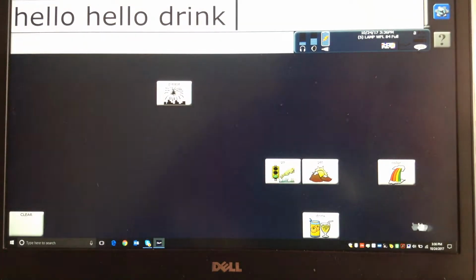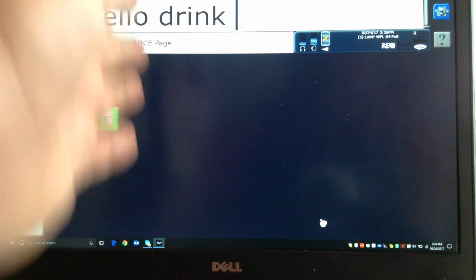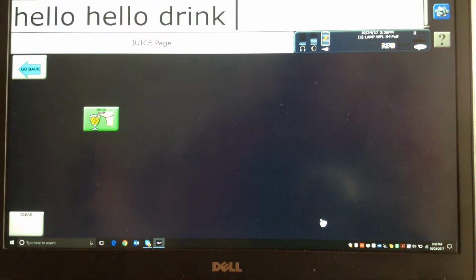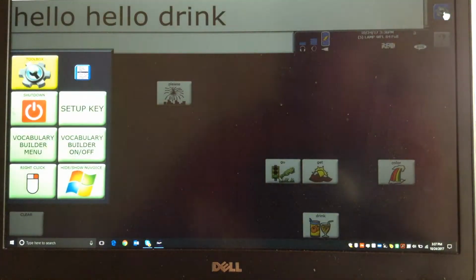So see how they're floating now. So when I hit this one, see how there's just this icon floating in space. Now if I had a key guard on there, it would actually create the grid, which would make it work just fine. But without a key guard, those icons floating in space is inappropriate. So that's one of the examples of these small little things that to really follow the method well, you have to make sure you understand that you don't want icons floating in space.